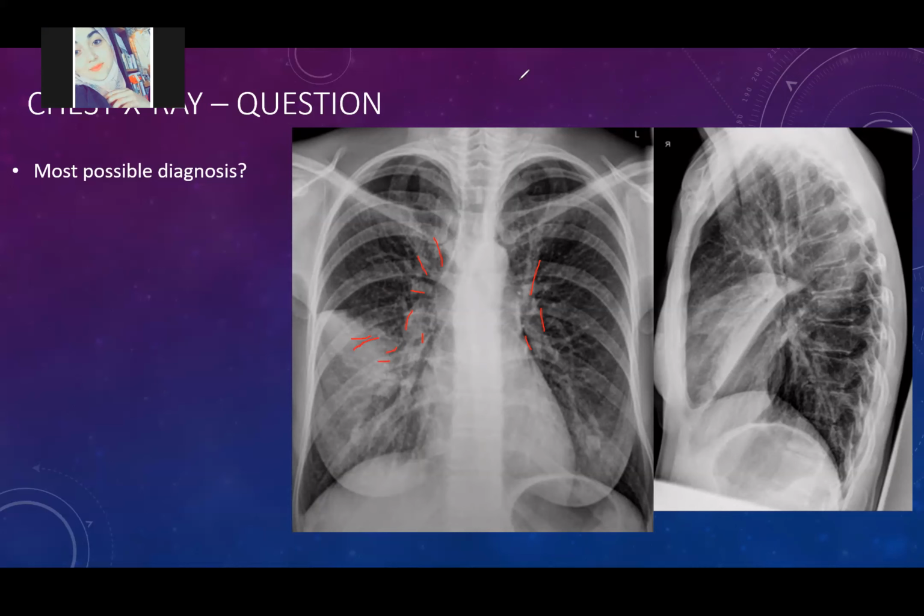Yeah, and on the left also, it's so apparent, I feel. But these are vascular structures, right? These are blood vessels. They are not bronchi because they are not empty inside. This is soft tissue density. Also, there is, I feel, some consolidation area on the right lung. This is a very prominent finding. Good. What else? It's consolidation. It is hazy, you cannot know the borders.